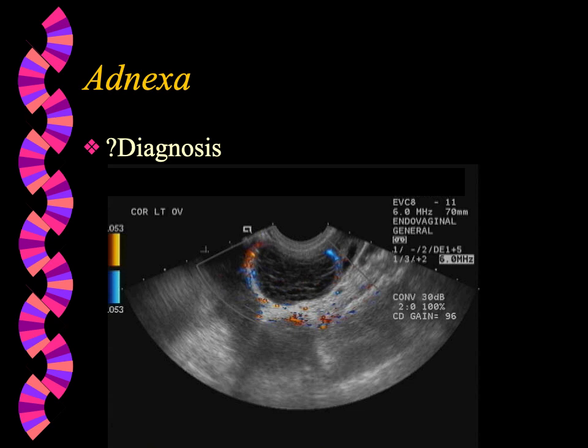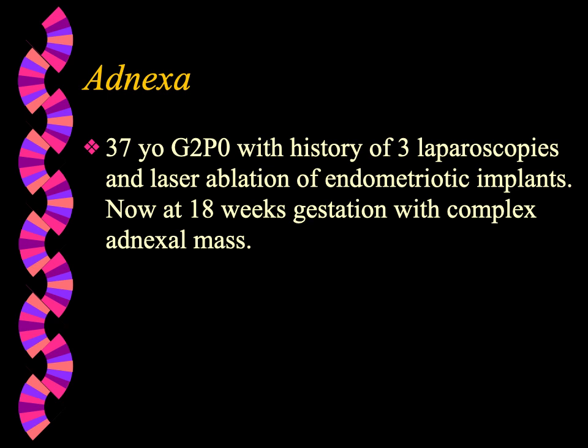And so for her, rather than jump to surgical management and risk castrating her, we allowed expectant management, and we did a follow-up ultrasound in 6 to 12 weeks, at which point this had completely resolved. So this was a hemorrhagic corpus luteum, which is not uncommon. And again, given her age, we felt very comfortable using expectant management.